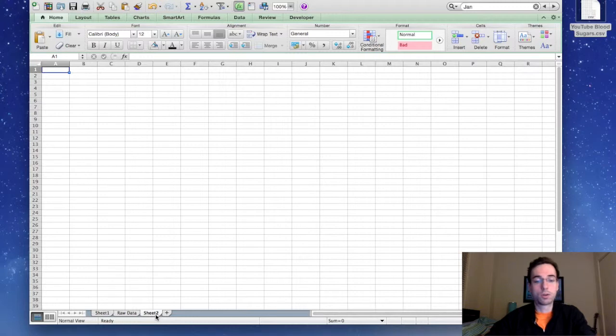So if you go to a new sheet, I'm going to call this test run. Come up with some yes, no, or binary variable. So for me, it'll be run today. Did I run today? And I'll put that in C4. And so I'll put date before that, and then run today. So start plugging in the date.